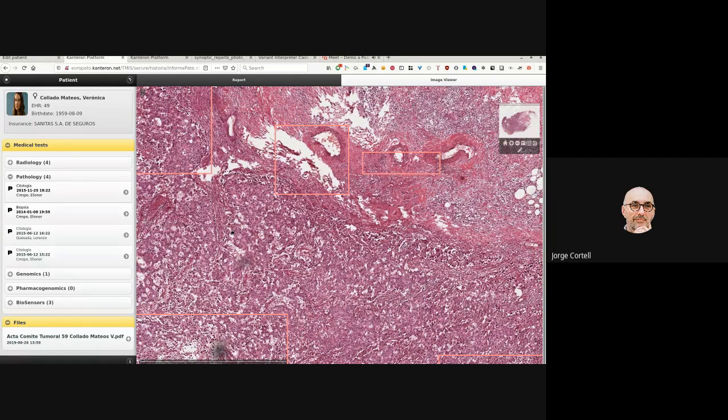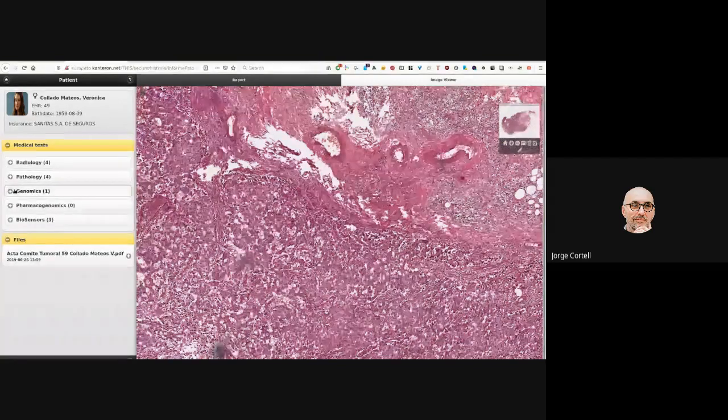You can then later export those annotations, then you can query, analyze all those. You can also make measurements, compare two slices, export the image, etc. So let's say, going back to the narrative, you saw a radiological report, you saw there was a tumor, and you opened the pathology. You saw the tumor, you saw the pathology report, you saw the cells are inflamed, then you go to genomics.